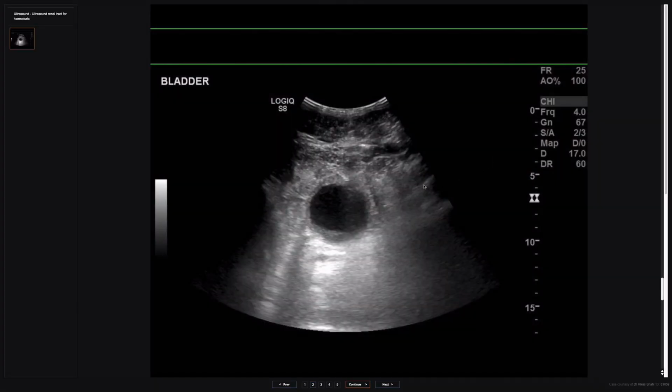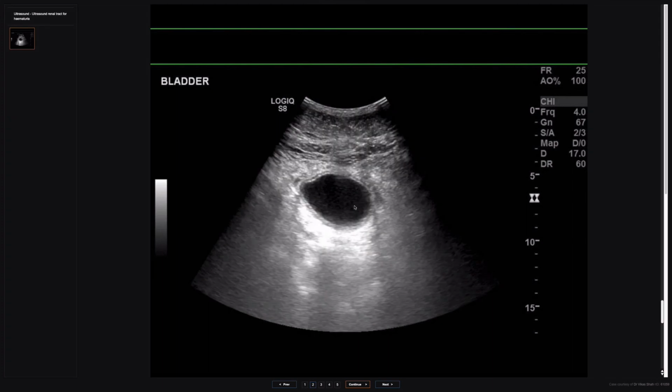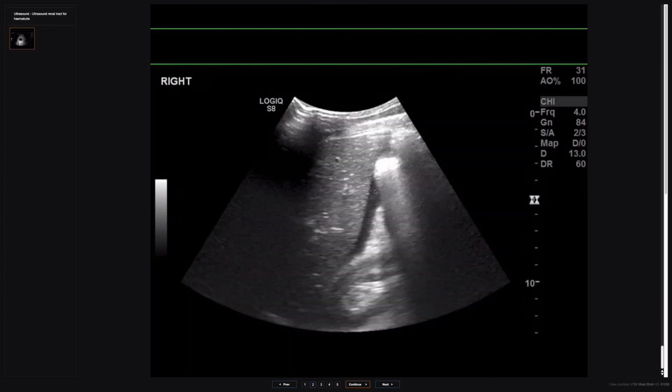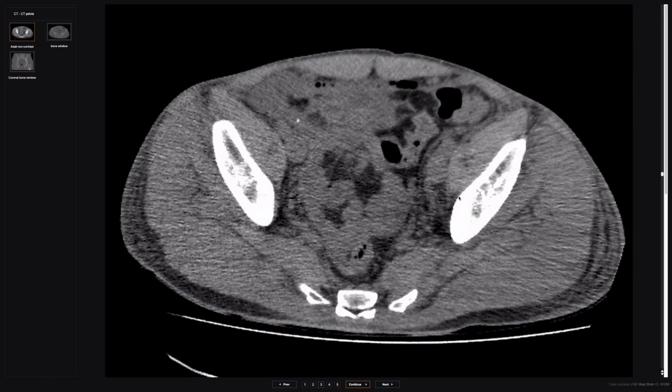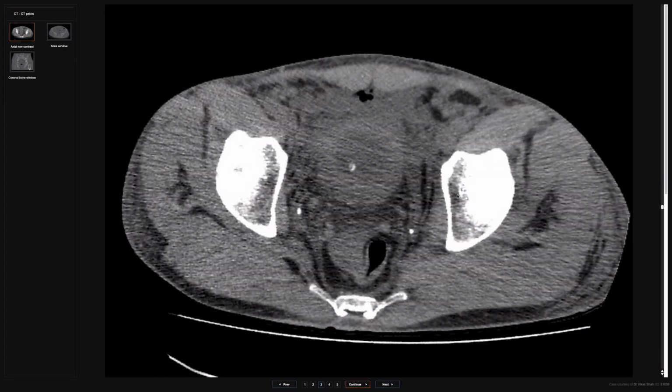He then had an ultrasound, and what was noticed was that there was free fluid in the upper abdomen. So at this stage, all it had was the plain films, catheterized, and then he had an ultrasound of his abdomen, and he's got free fluid. So that's concerning. He then had a plain CT for planning of fixing of his pelvic fractures.